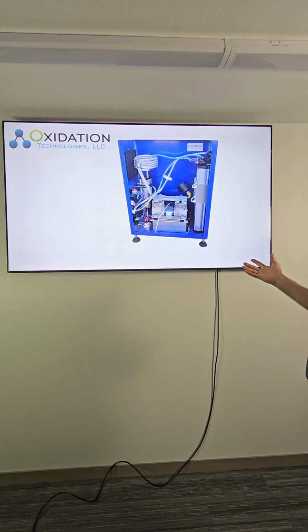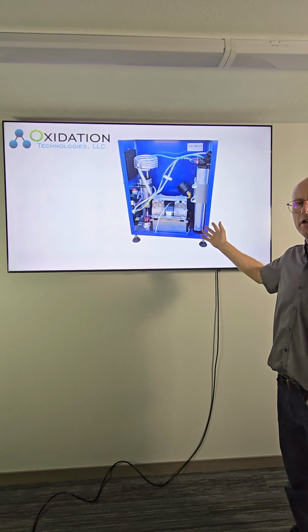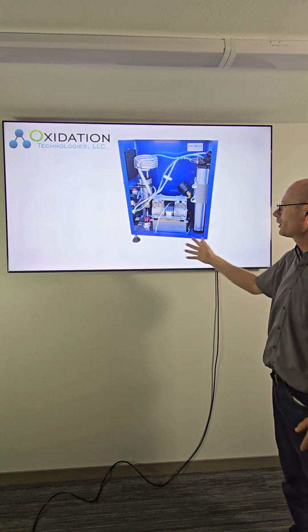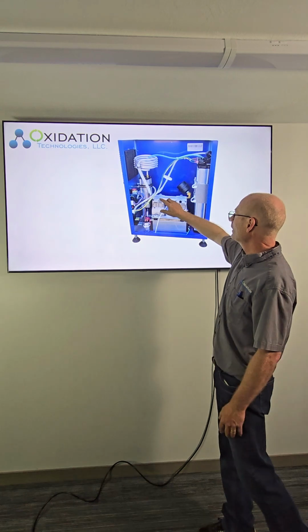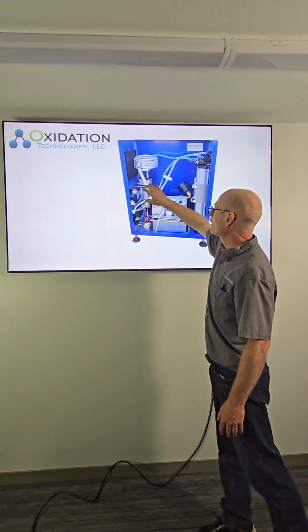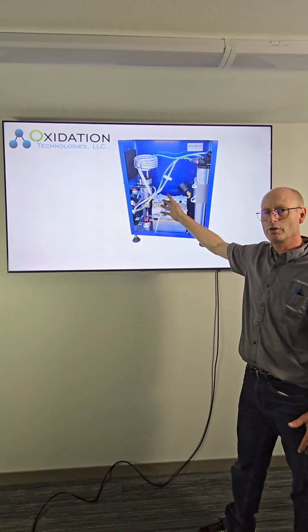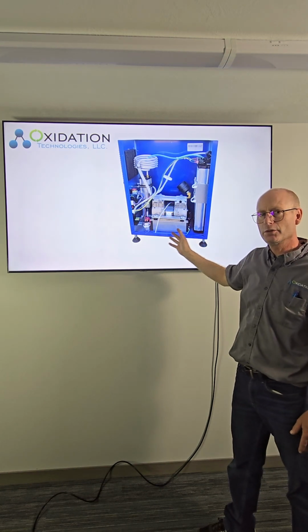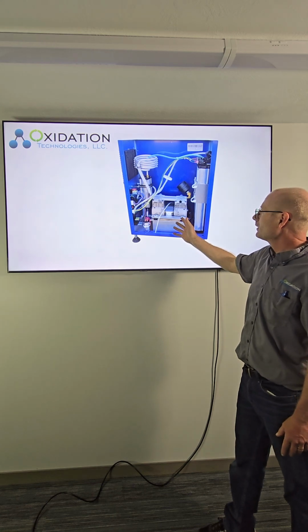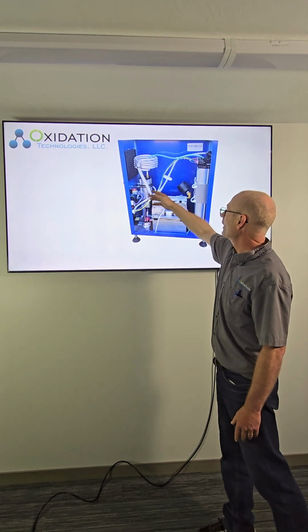And back again to an actual concentrator that has all the parts. The bigger concentrators, all these components separated out, but here's that compressor again. Cools the air down a little bit to remove some of that water. Water is an enemy of a sieve. We try to get it as dry as possible. If we have too much water, that water zone is going to increase, and eventually it's going to ruin your sieve. So we get rid of as much water as we can.